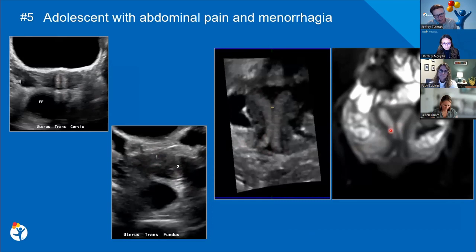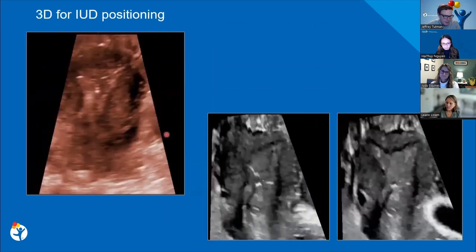This was an abdominal pelvis MRI that was done for a separate indication. So this image quality is not quite as good as our dedicated pelvic protocol that we do for these. But again, I'm not sure that MRI adds a whole lot of additional information beyond what we already got from our ultrasound.